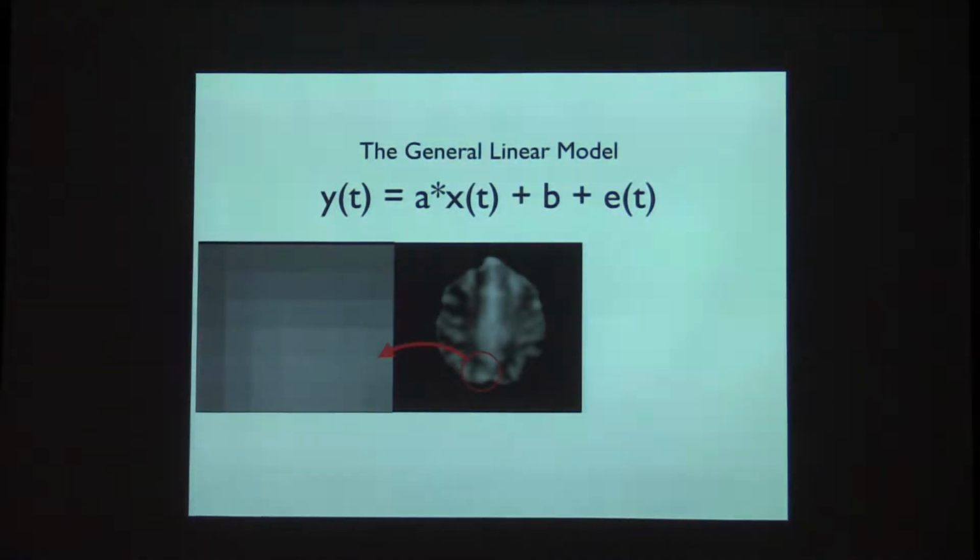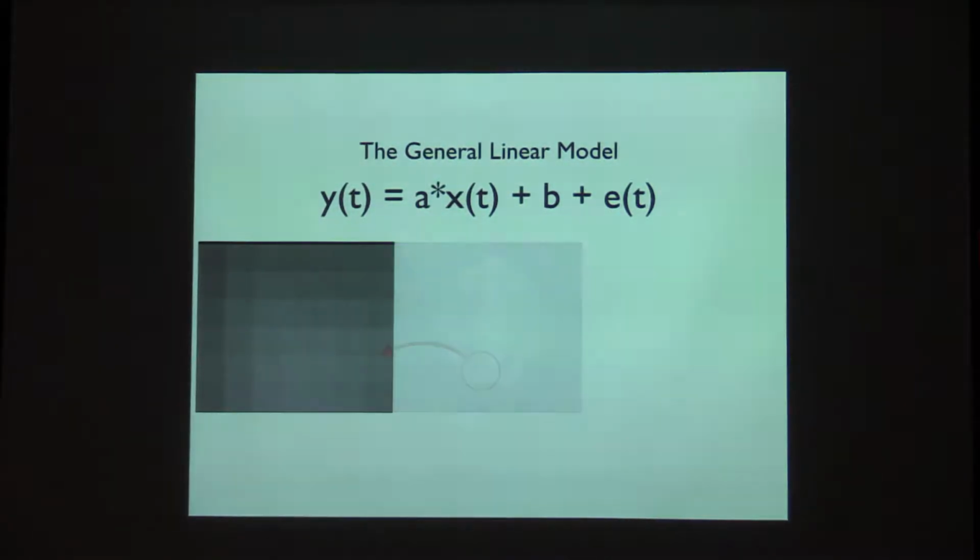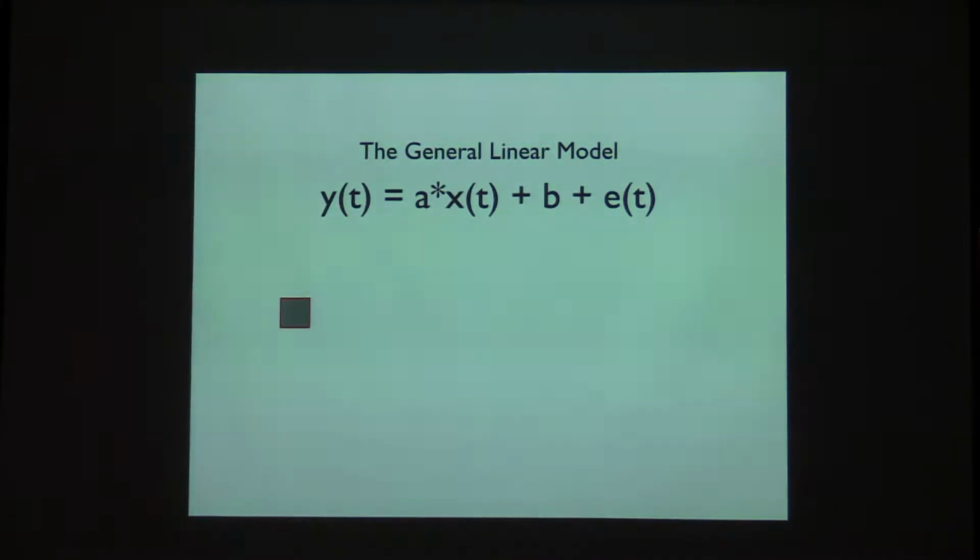So if I zoom it, this is a real fMRI study that we did, and you see there's some gray going up and down. It kind of looks random, yeah? But let's say you take one of these voxels and say, okay, what's going on in that voxel during this fMRI task? And you can do it if, again, bright is whiter, and then the dark is darker gray, yeah?